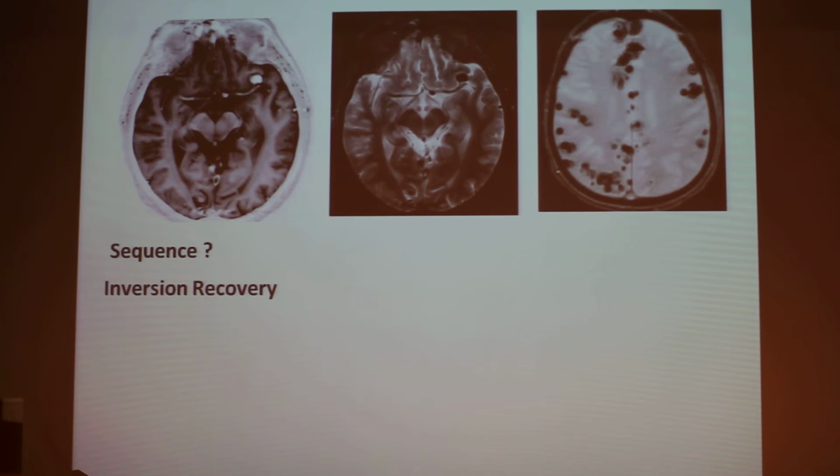Of course, when you have an aneurysm, you look for blood. And there is a lot of blood. This patient came with no headache, nothing. Amyloid? A lot of aneurysms? Yeah. Aneurysms everywhere? Behçet syndrome. Small aneurysms. No?